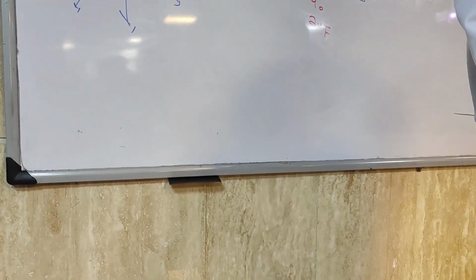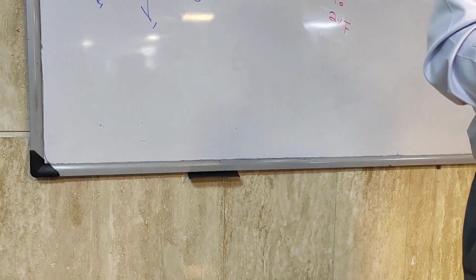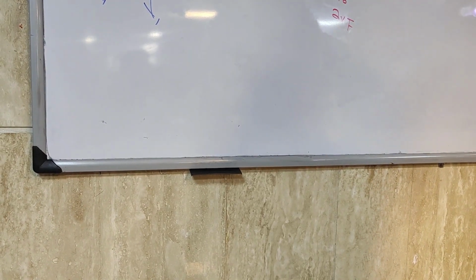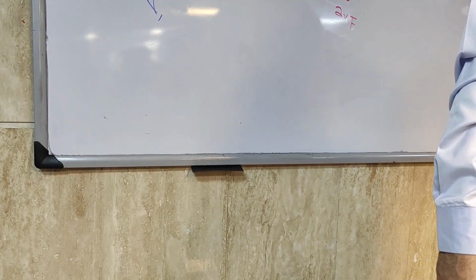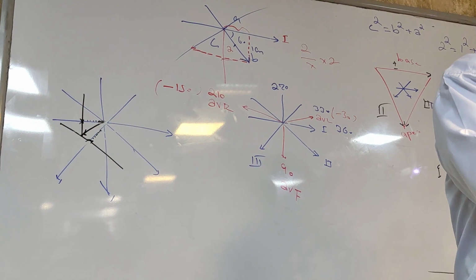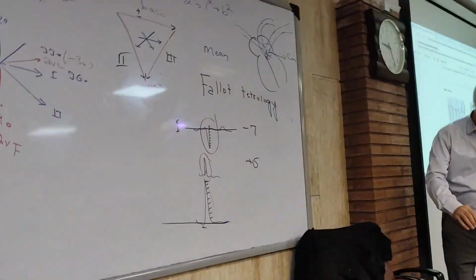Current of injury means you do not have zero voltage here at the TP segment. There is always a depolarized part, for example, in the lateral wall of the left ventricle, in the lateral wall of the right ventricle, somewhere in the septum. So you have a current of injury. In order to find it, you should take a look at the ECG trace at the TP segment. Make a straight line. Take a look at the picture. Take a look at the figures we have in the book.